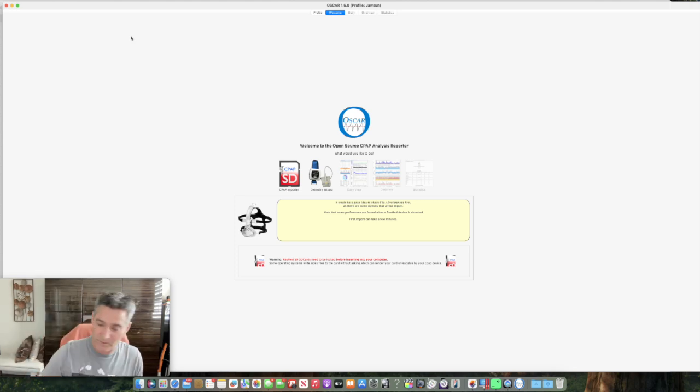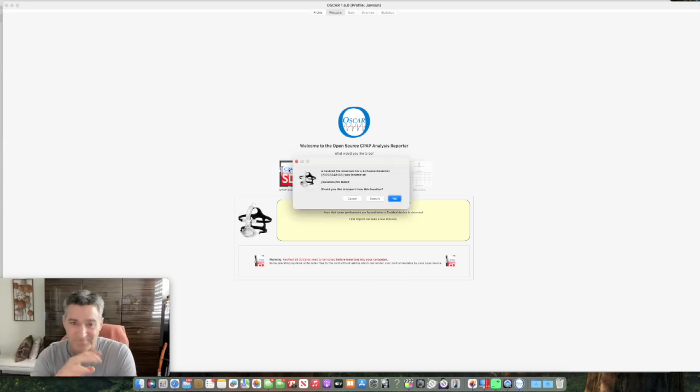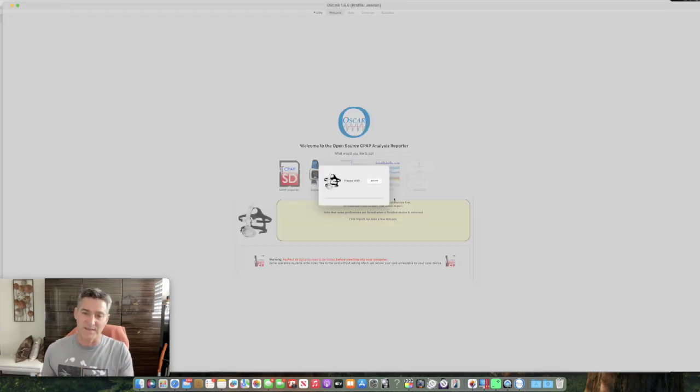So, beautiful, we're past that. Now I want to go to CPAP importer. I have my data card in there for my CPAP device. I'm going to hit insert. Oscar is really brilliant in that it sees the file structure of what you need to import, and it found it. It's like, hey, we think we found it here. You want to import it from there? I know that that's the correct location, so I'm going to hit yes. And then boom, it's going to take a little bit.